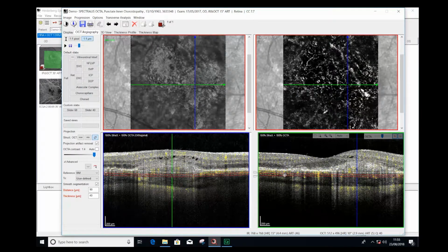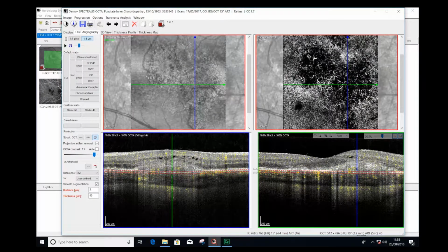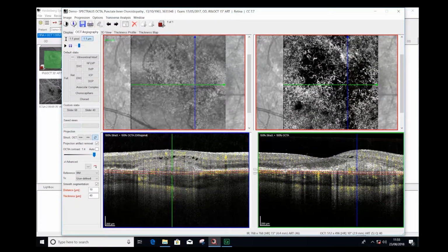This is a case of multifocal choroiditis that has some of the characteristic imaging qualities. The multiple discrete type 2 lesions would be consistent with this. Of course, it's important to put these imaging characteristics in context with the clinical picture, the patient's age, the inflammation within the vitreous, and also to look at the periphery to see if there are any characteristic signs as well.